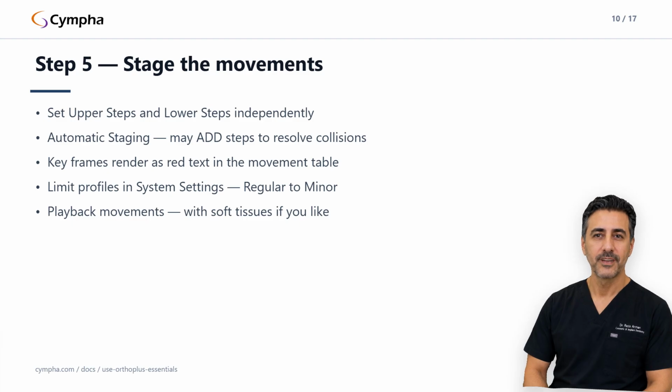Expect calmly that some steps may be added to the plan. That's the stager resolving collisions, not a bug. Review the added steps rather than deleting them.